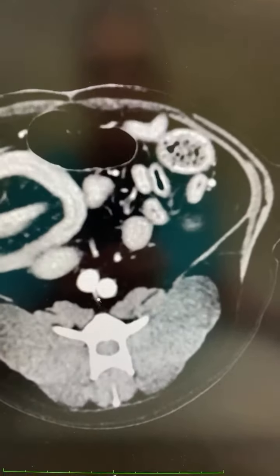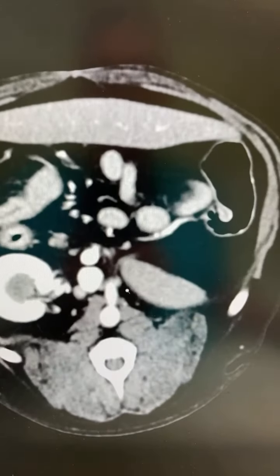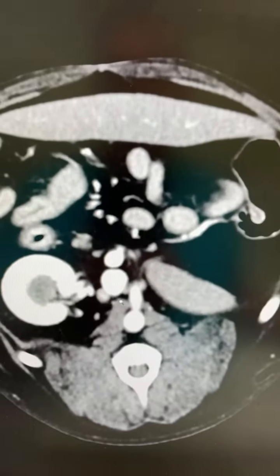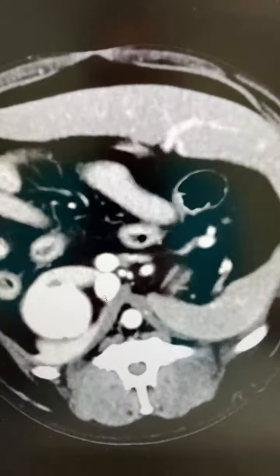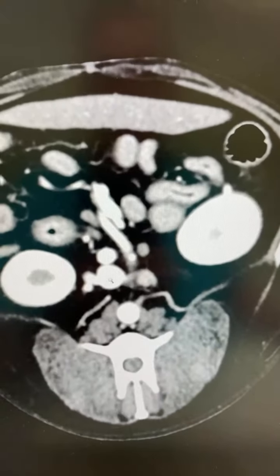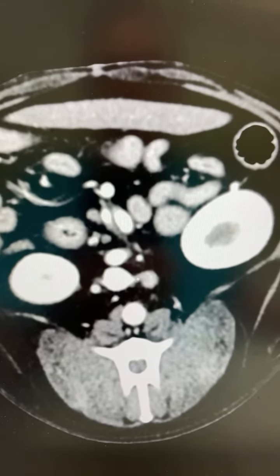And there are lymph nodes in the abdomen along next to the aorta and the vena cava, and even up here in the abdomen. Now, how do we distinguish those from the adrenal glands? So the adrenal glands are going to be cranial to the respective kidney. That's an adrenal gland sitting right there, cranial to the respective kidney. When I go back and look at the left one, it's cranial to that kidney as well. And the other thing that we look for is that the phrenicoabdominal vein, which is sitting right here, passes over the top of it.